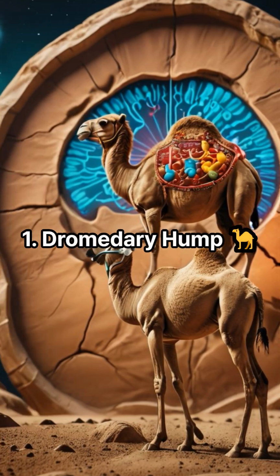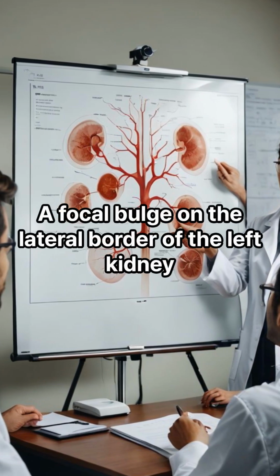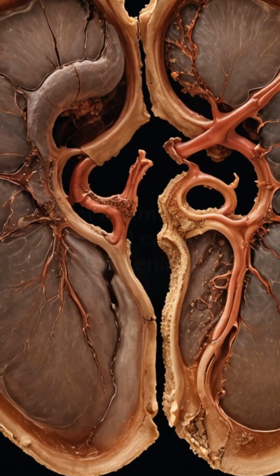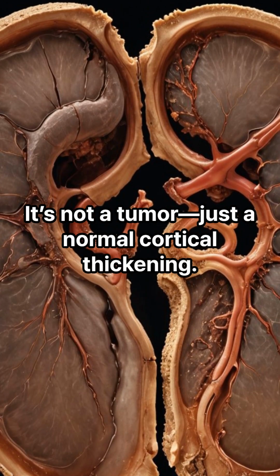1. Dromedary hump. What is it? A focal bulge on the lateral border of the left kidney, due to impression from the spleen. It's not a tumor, just a normal cortical thickening.